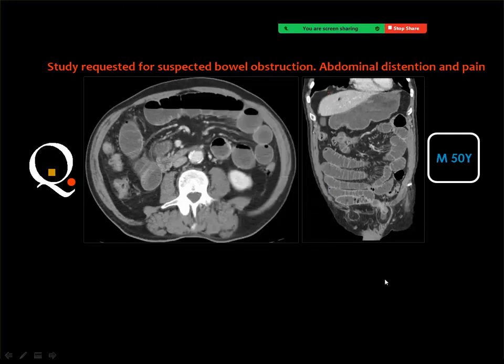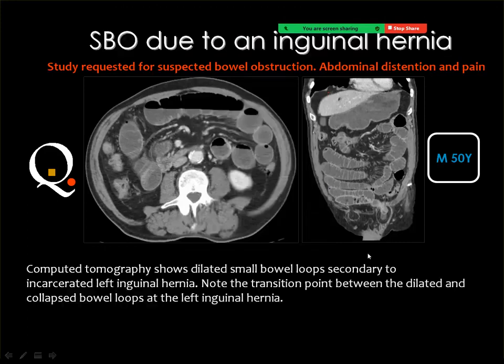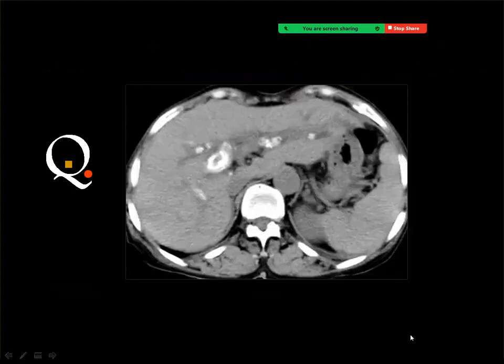Inguinal hernia with a small bowel obstruction. Very good, very good. And this is hernia, in that there is extension of the bowel into the inguinal canal. And at that time, you should consider this hernia as incarcerated hernia, because if it is not associated with intestinal obstruction, you consider it simple hernia. But if the hernia is associated with obstructive changes, that's to say that it is incarcerated, meaning that it is not reducible. So it has resulted in this obstructive change.